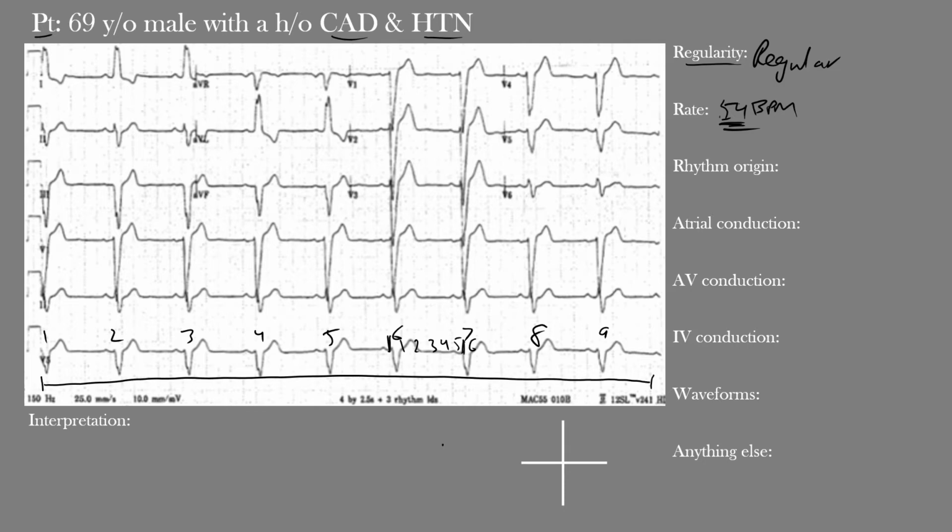Well, the QRS complexes here actually appear wider than normal, so that doesn't really help us tell whether we have a supraventricular rhythm or not. It's pretty much anywhere. But we can actually make out clear, well-defined, similar-shaped P waves. So let's see if we actually have sinus rhythm present.